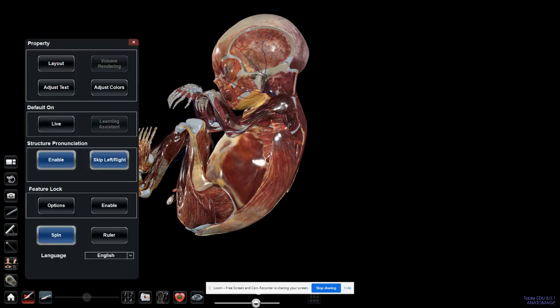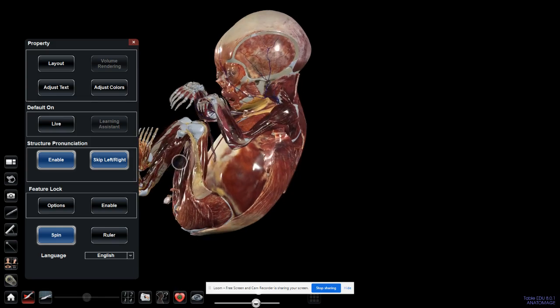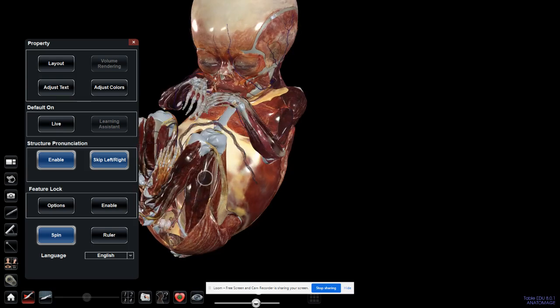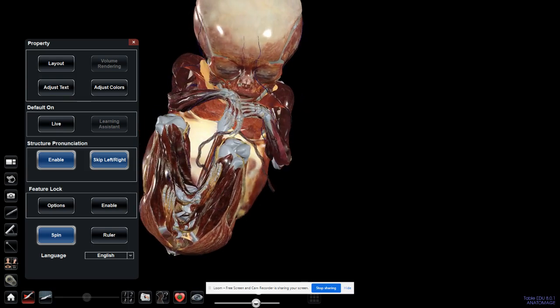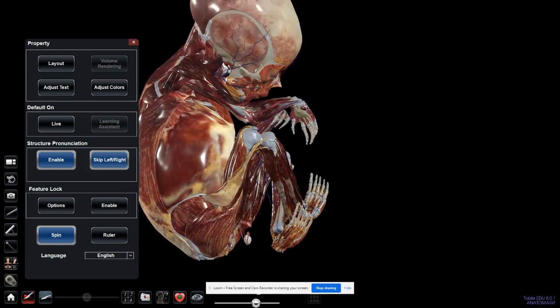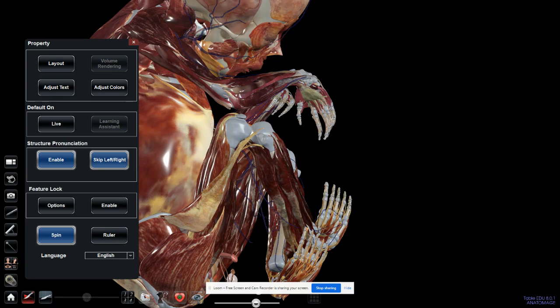The live thing here is this heart button, which shows the blood flow, as you can see now here. You can see the blood flowing. So this live thing gives me this option to click this blood flowing through the veins or not.